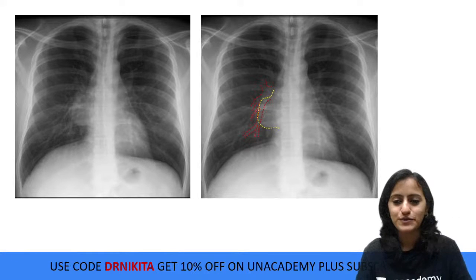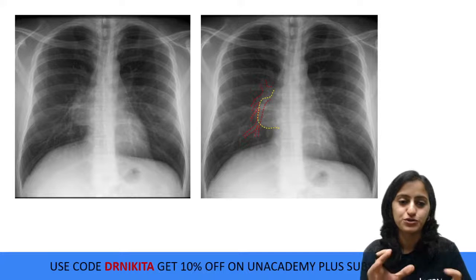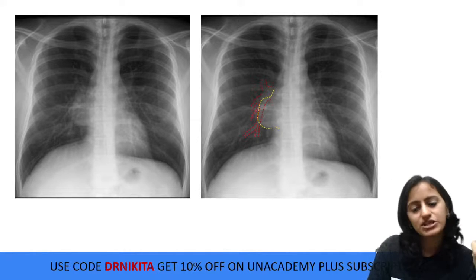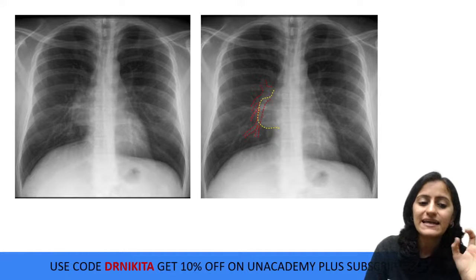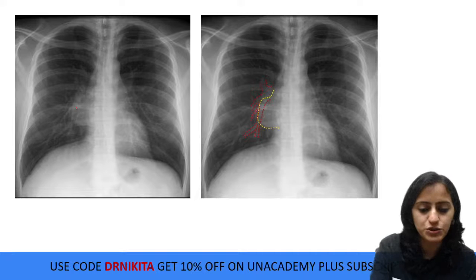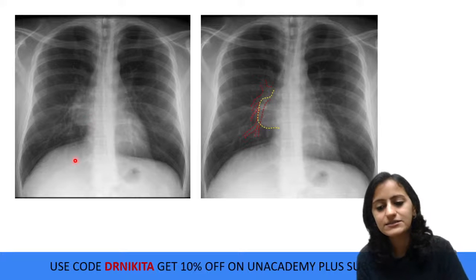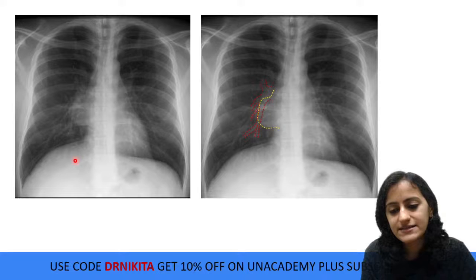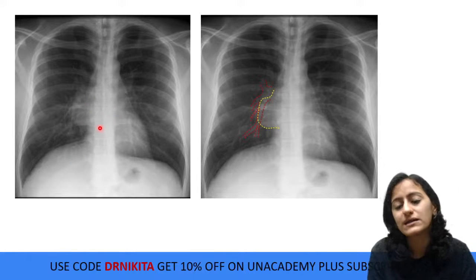Next one. Okay, so we are here at the last image. So this was basically a patient who had just come for a health checkup, a chest x-ray, and incidentally this mass was noted on the right side. What sign are we seeing here? Yes, we are talking about your Hilum Overlay sign.